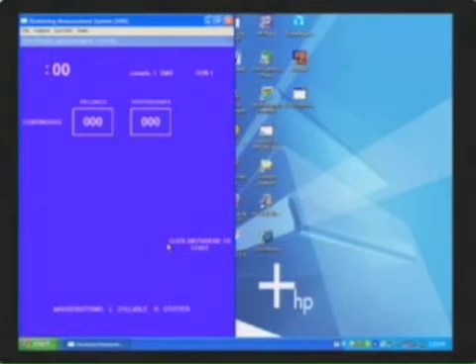When all of the parameters have been set to your liking, click OK. This advances you to the data collection screen, which you will see as you collect data. At the top left of the screen is the clock timer showing 0. At the top right is Sample 1 SMS, the sample name, and the run number, which for the time being is number 1.